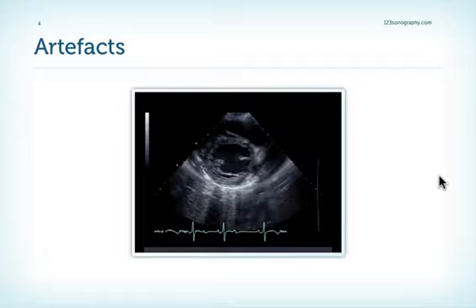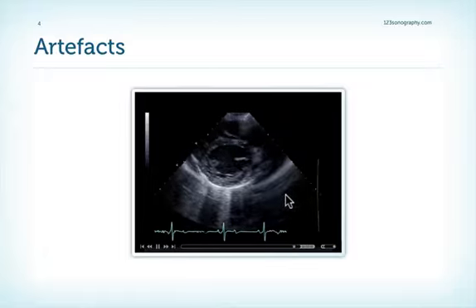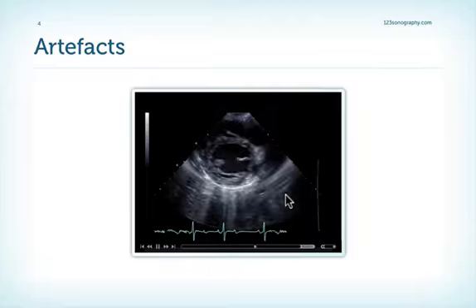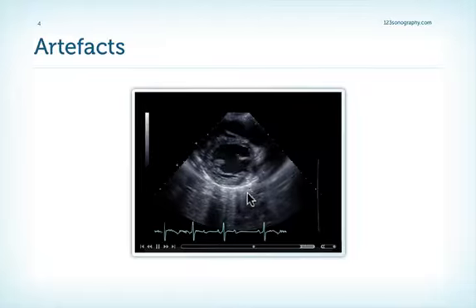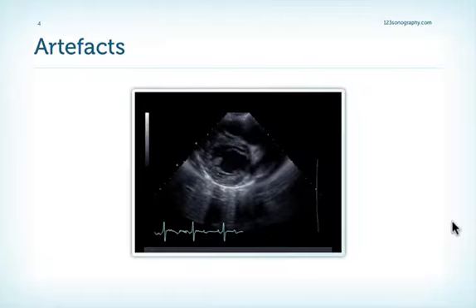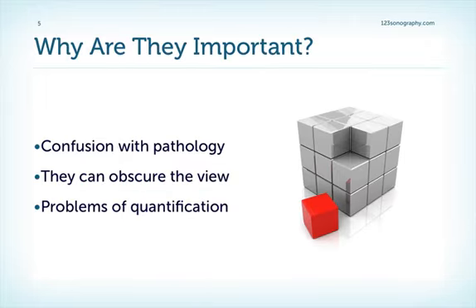Take a look at this image. The image quality is superb, but then there are still some structures which cannot be explained simply by anatomy. For example, what are those structures which move down here? And why are the echoes so bright right here? And why do we have shadowing? Well, the object of this chapter is to explain why artifacts exist and how to interpret them.